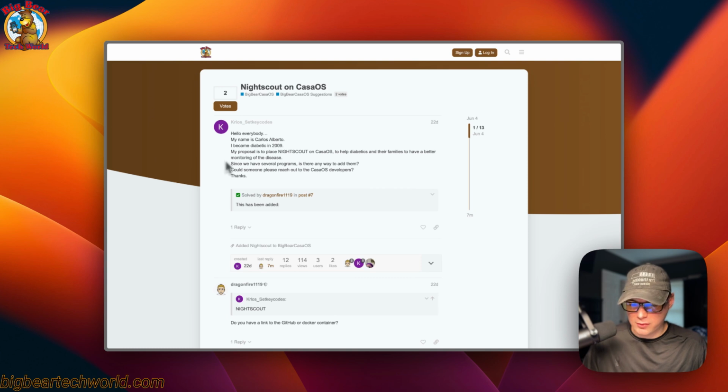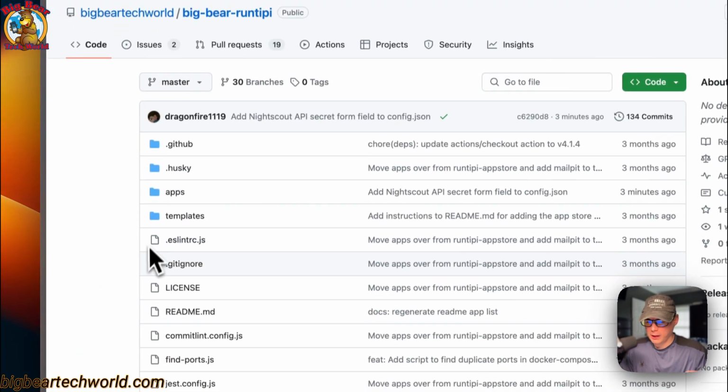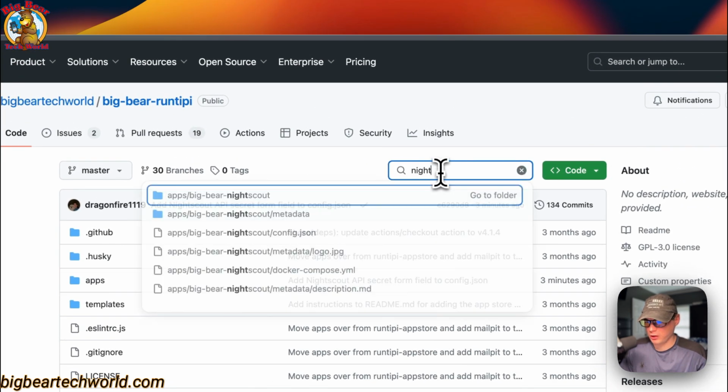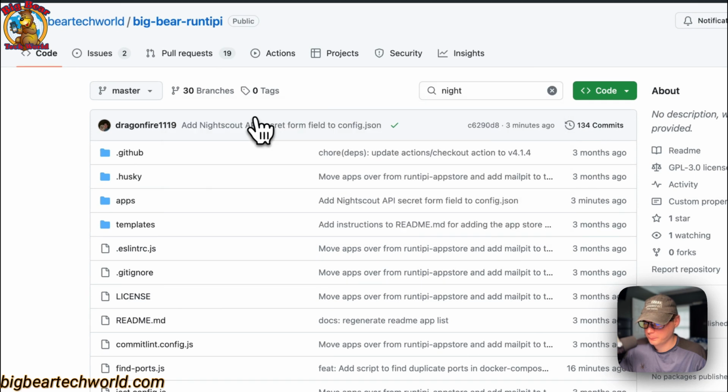So let's get started. So now we're going to start on Big Bear RunTipi, and there will be a link down in the YouTube description to get to this. I'm going to go over the search and type night, and now you'll see apps, Big Bear Nightscout right here.